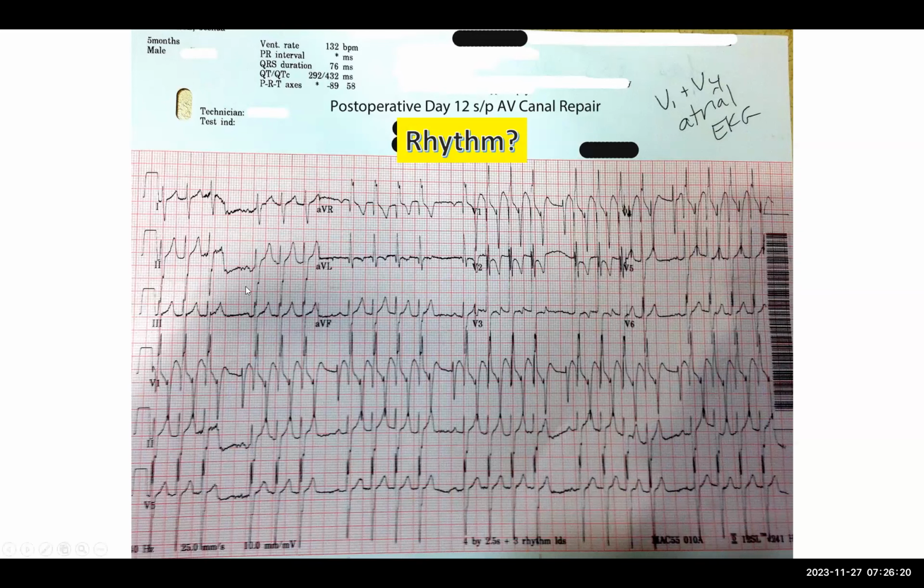But in fact, there is a subtle increase in the PR interval. It's from here to here. The other thing that often goes with this, and this is a good clinical pearl to go forward, is when you see block in a grouped fashion. So you see 3 beats in a row, then a block, 3 beats in a row, a block, 4 beats in a row, and a block. When you see this type of grouped beating, almost always that's a sign of Mobitz 1 block. This is a good clinical pearl.